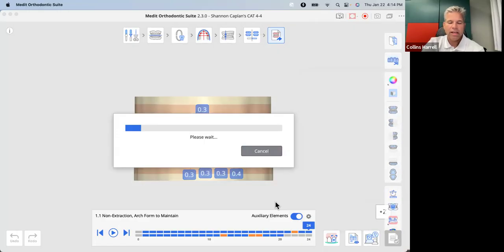It should show you how many aligners you're buying and how many other things like templates or retainers or things like that. And they're all at $18 per arch in the US because that's the only place it's available right now. We're getting very close to it being available in lots of places worldwide. We just have to get some regulatory clearance. So let's give this just a second so I can show you the checkout page.